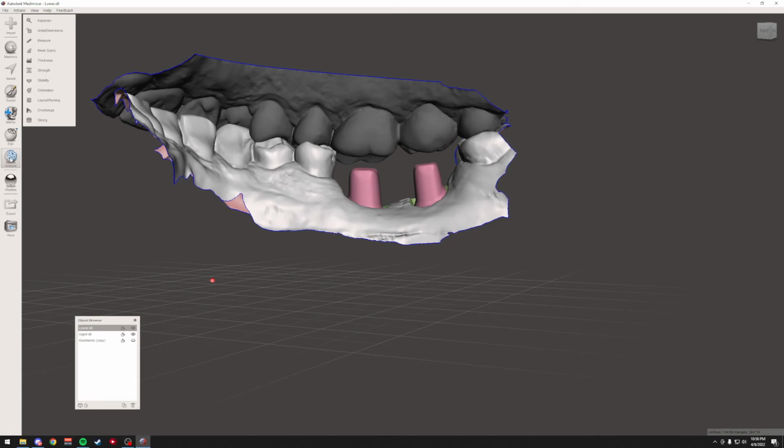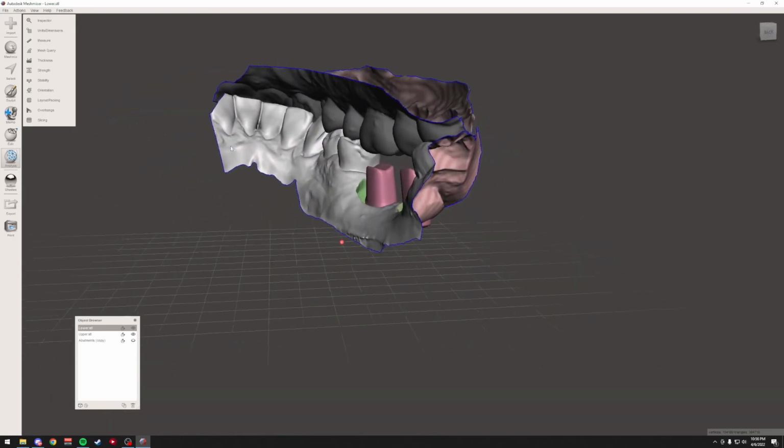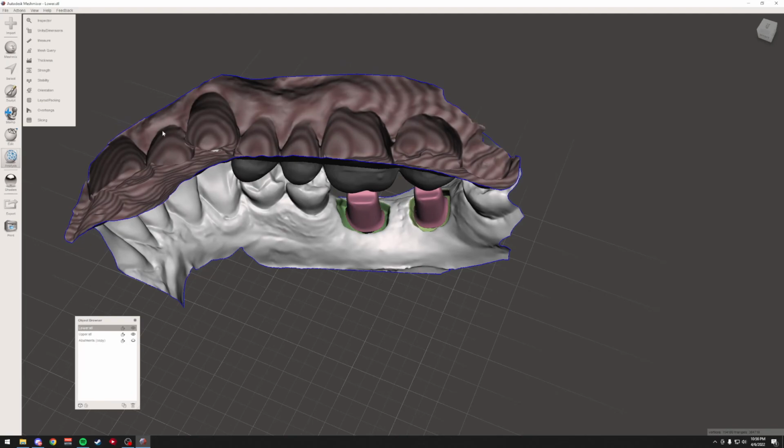And you saw, I'll show you again here in Inspector, it has an Auto Repair All. The only time you're going to want to use that is after you've put bases on your models, where the only possible open spaces are areas where there are errors in the mesh. With open manifold scans like this, you want to stay away from that.